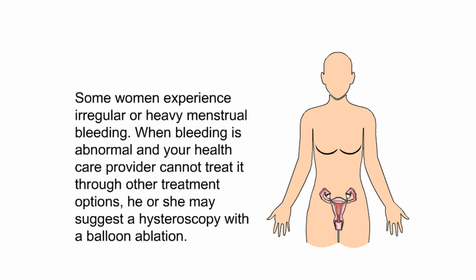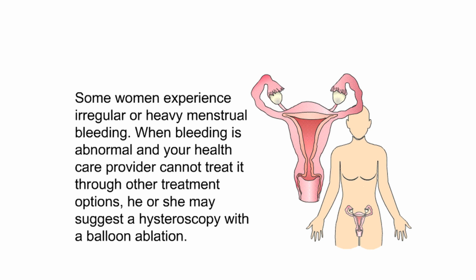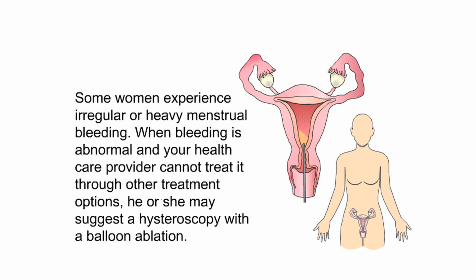Summary. Some women experience irregular or heavy menstrual bleeding. When bleeding is abnormal and your healthcare provider cannot treat it through other treatment options, he or she may suggest a hysteroscopy with a balloon ablation.